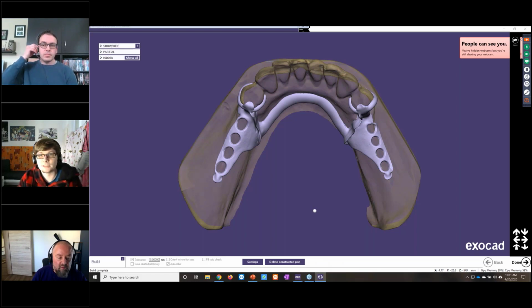In fact, it's the length. So the value you enter here is the length of the longest triangle you can create. So the higher the value you enter here, the larger the triangles will get, and the smaller your file size will be. But you have a lower resolution then. I think if you go bigger than 0.025 or something like that, then maybe, Friedemann, maybe you have experience, at some point you will start seeing a difference in the printing results.